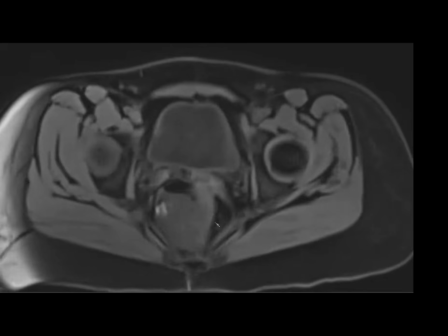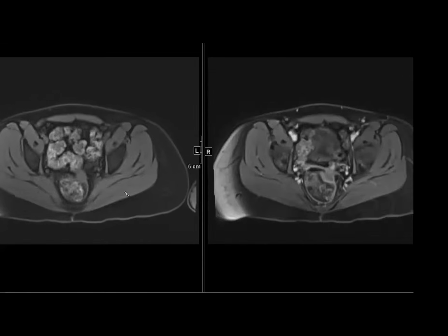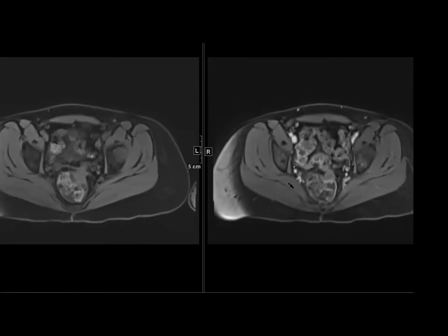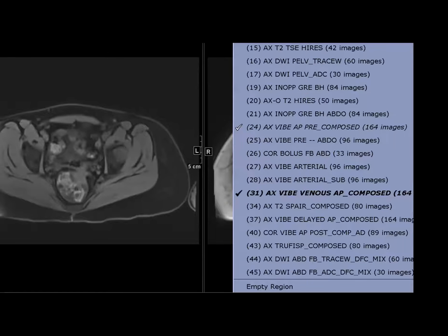I know, right? Seriously. So one of the clues is that this is the T1 pre, and we don't see any hemorrhage. We don't see any T1 hyperintense foci. But you don't have to see T1 hyperintense foci. I know, or DIE, right? I still, in retrospect, we call this endometriosis, right? Anyway, turns out this was a leiomyoma.